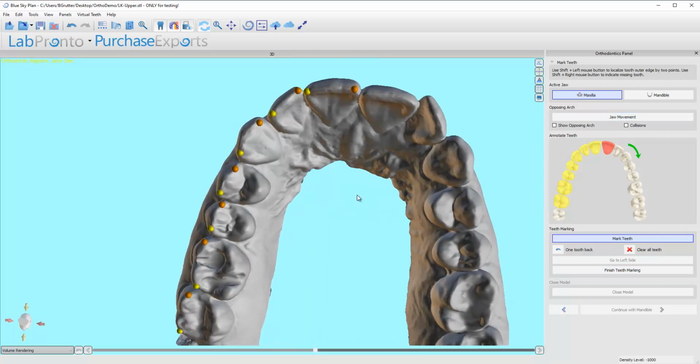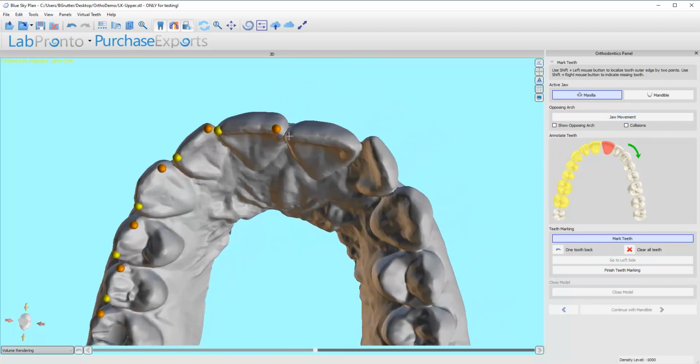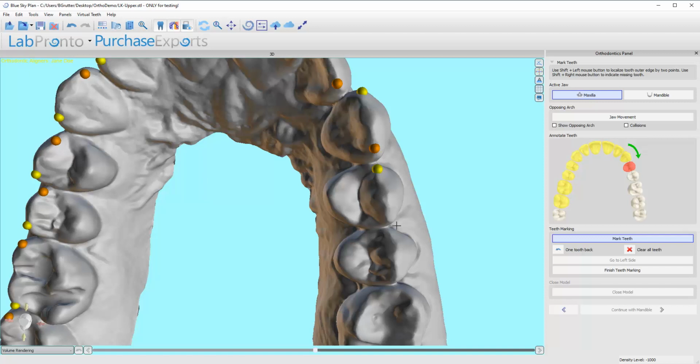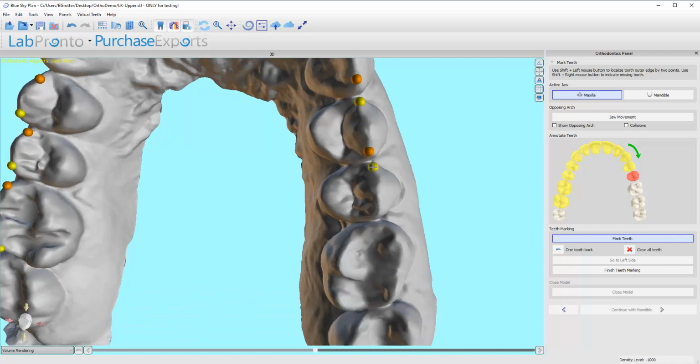So it's okay to right click the edentulous spot. I did that for a long time and it didn't hurt me, but I did find that it made things a little bit easier down the road if I did it this way instead. So my current recommendation is to go ahead and just click that button, go to left side, and that will allow you to proceed with the other central incisor.